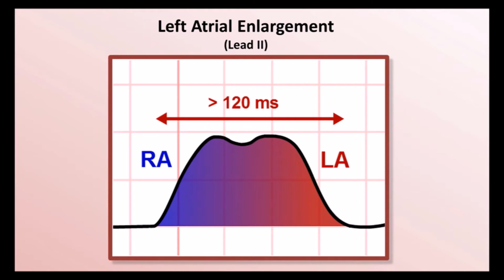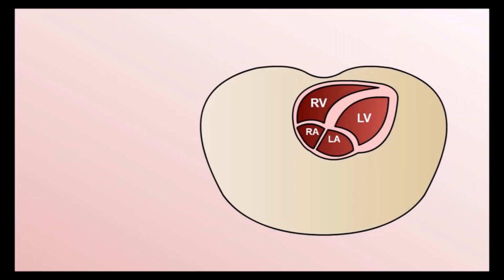Another effect of atrial enlargement on the EKG can be appreciated in the precordial leads, specifically lead V1. Here is the heart lying in the chest as seen in axial cross-section. The sinus or SA node, for sinoatrial, is located approximately here. Strictly speaking, the sinus node lies superior to this particular plane. However, this graphic is obviously just an approximation of the anatomy. Here are the precordial leads V1 through V6.